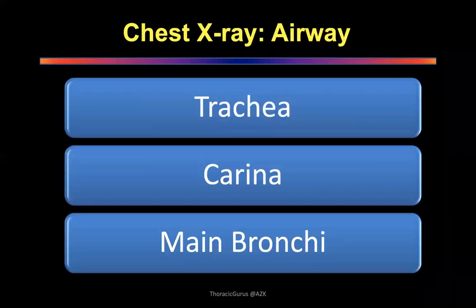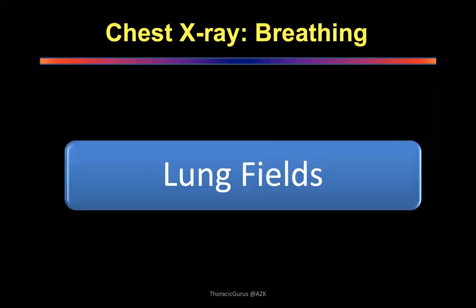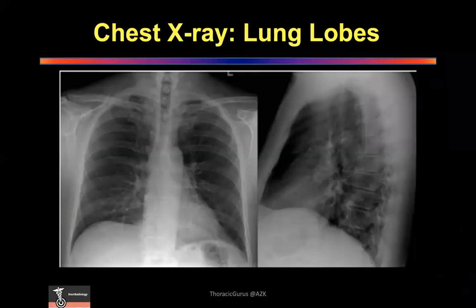This is easy. Airway, we know what it is. Trachea, carina, main bronchus, not a problem. Breathing is lung fields. Don't forget to look at the lung fields.